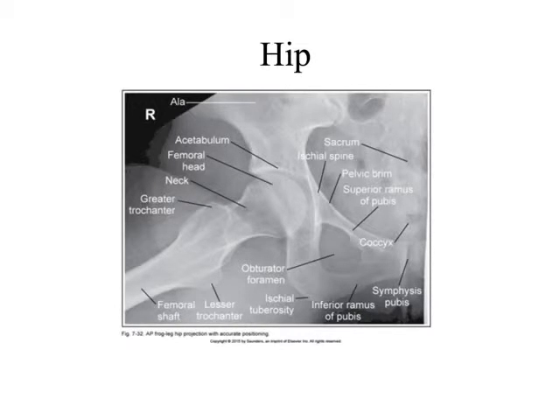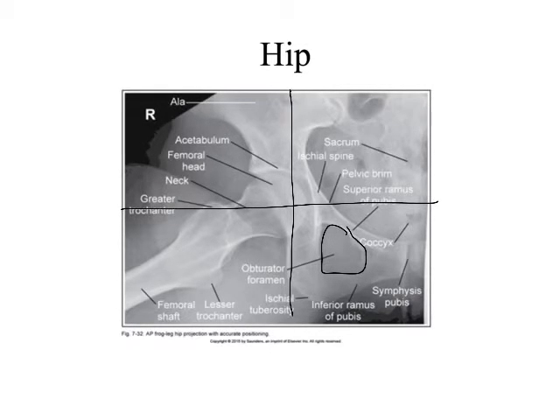So where are we centered? Yeah, right on that acetabulum, right? And we can do that by dividing the film into planes. And then, what do we know also? So we have now the obturator foramen here, and that's telling us what about what we're seeing on this image? They're not rotated. They're appropriately positioned in terms of the patient's hips.